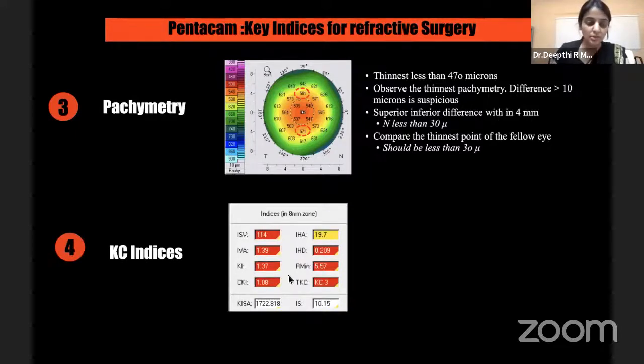You also have the keratoconic indices which the Pentacam provides. Basically, KC indices are from the era of the Placido. They derive from your surface scoring or surface irregularity. There's no consideration of your posterior surface or pachymetry. So I do take it with a limitation, but yes, looking at all of these being normal reassures that it's all fine.